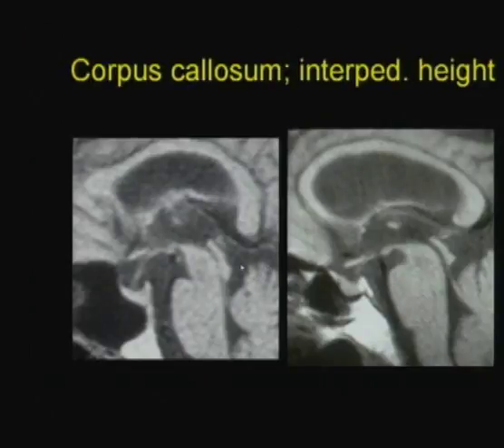How does the sagittal view help? Well, MRI has been extremely helpful in this regard. In the typical atrophy patient, you see a kind of an undulating corpus callosum. In the hydrocephalus patient, you see a stretched corpus callosum. You see very tall ventricles. The ventricles get huge in hydrocephalus. They don't get huge in atrophy or aging.